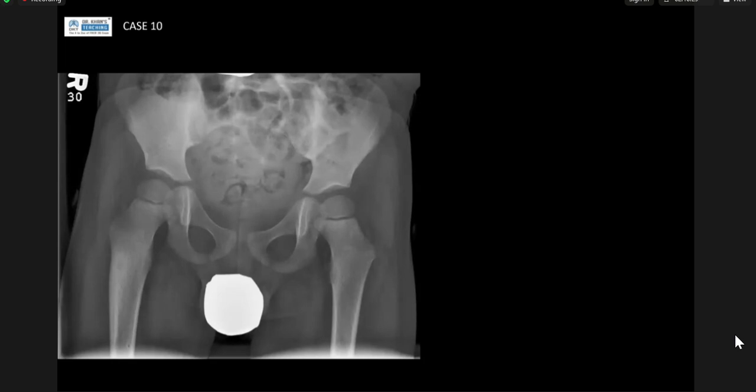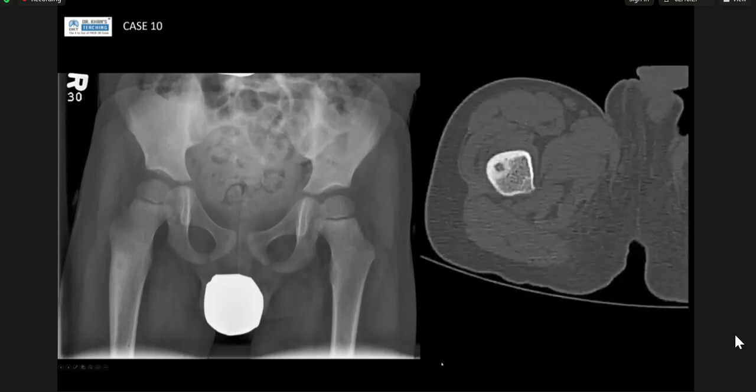So for nidus, it would be CT. Okay, good. So here you can see a nice example of that cortical thickening, the surrounding sclerosis, and the central nidus in the middle of that. So really well identified on the plain film. And you can see how this looks very different to the non-ossifying fibroma that you described before, candidate 2, yeah?